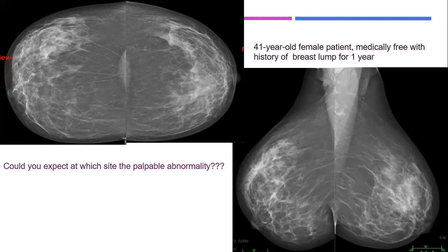Can you appreciate it on the MLO now? Still difficult. Why is it difficult? Because of the breast parenchyma, even on the MLO.